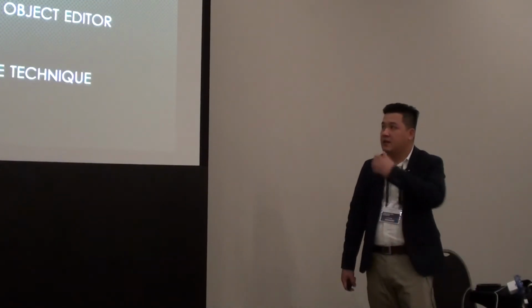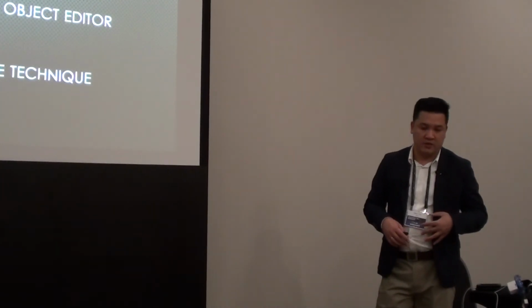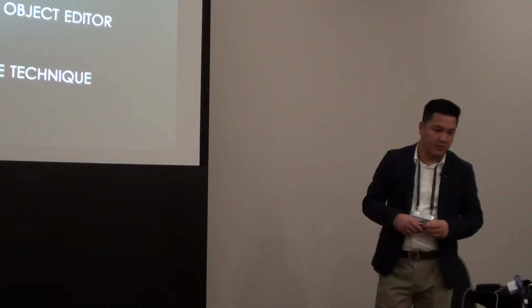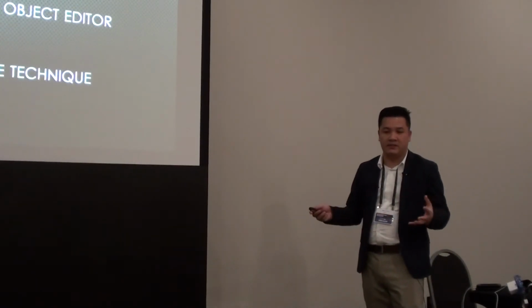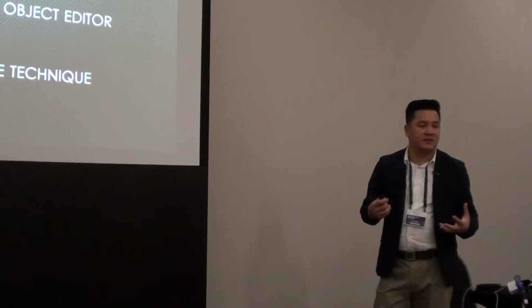So there's plenty of benefits to that. There are a couple of limitations to the denture design, though. One of the scenarios that we may have is the patient likes their denture very much, and we're going to cover that in a moment, but they want to replace those teeth.